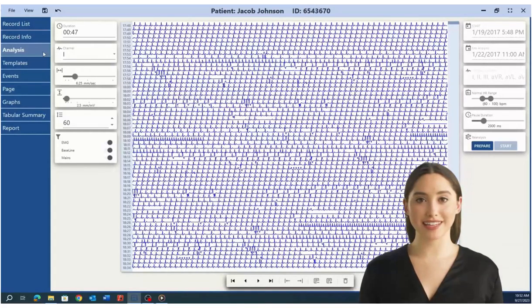To commence the analysis and deliver a comprehensive report, follow a general top-down logic of the View sidebar on the left side of the screen. Let's start with launching the analysis.